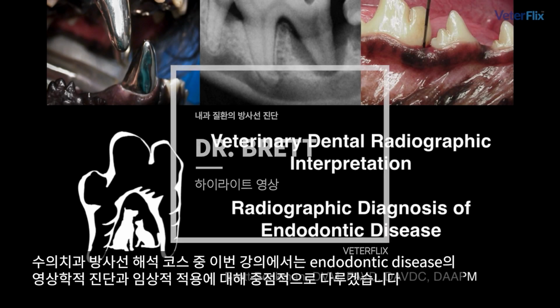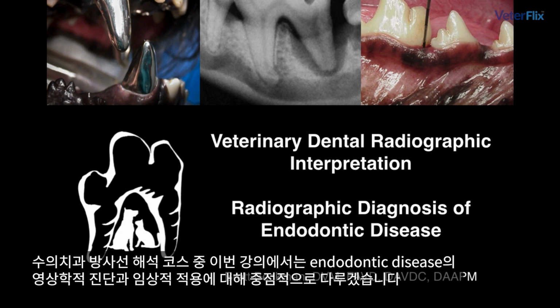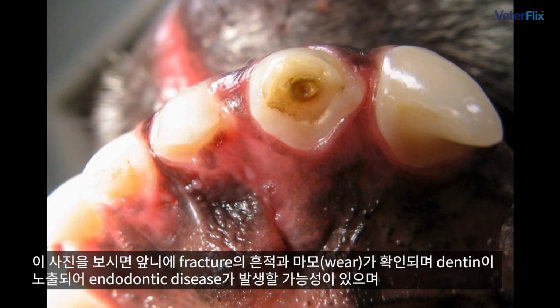This portion of the course on veterinary dental radiographic interpretation will center around the radiographic diagnosis of endodontic disease and clinical applications that are associated with that. You take a look at this image and you'll see this incisor has some evidence of fracture and or wear. And anytime that we have exposure of the dentin, we have a potential for endodontic disease to occur.